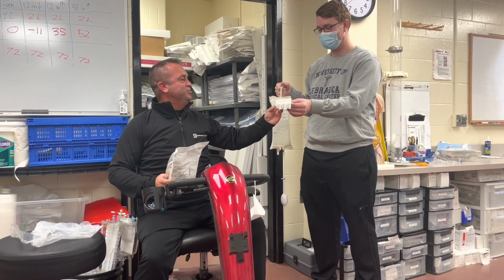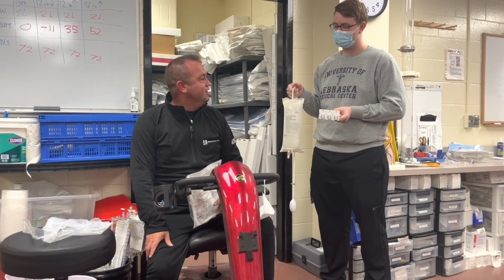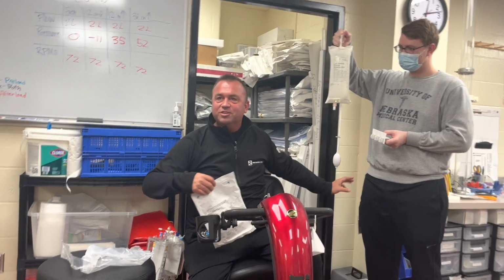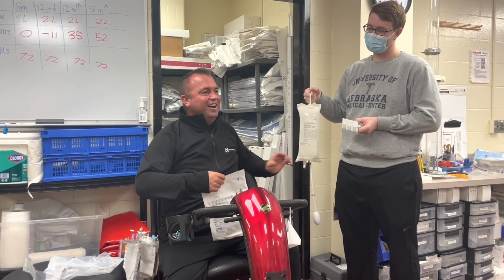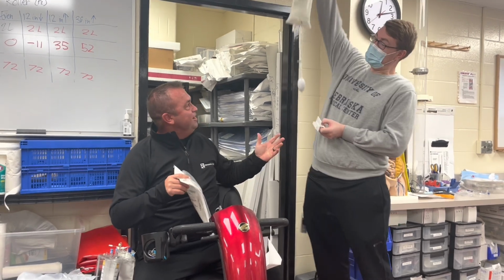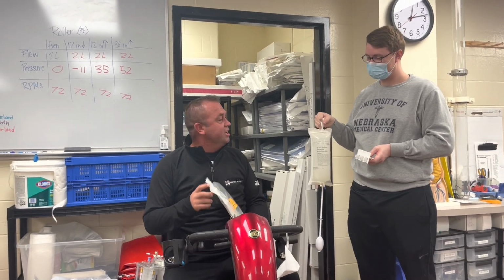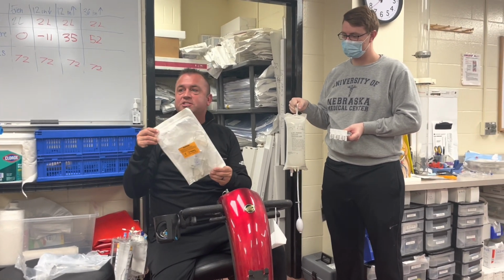Let's try this. Generally on the IV pole, there will be a transducer clip as well. So, let's raise this just a little bit so it's always higher, just in case the pressure isn't. I'm joking. Your arm's gonna die. So our IV pole has this already set up and going. So the next thing we're gonna do is, so we've got our bag ready to go. We're gonna find our transducer.